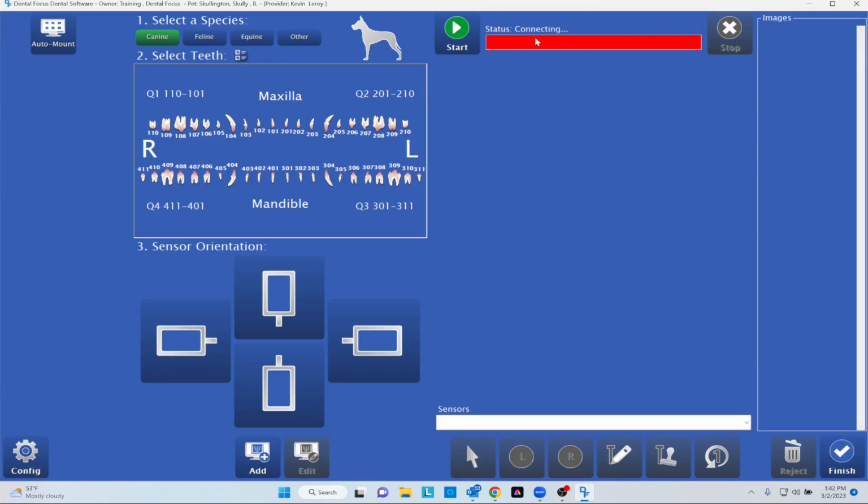Once we place our sensor plug into the USB port, I recommend using a 3.0, something on the back CPU of your computer, something that has direct power. Also recommend not using any type of USB hubs or extensions of any sort.